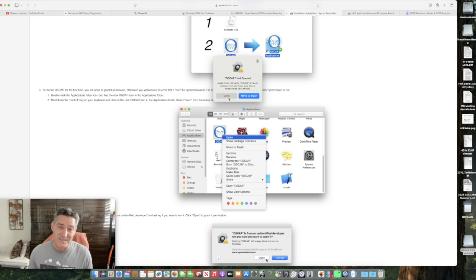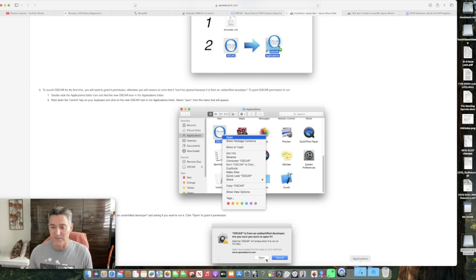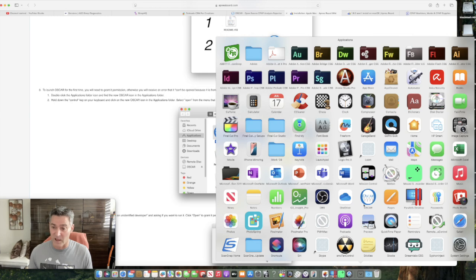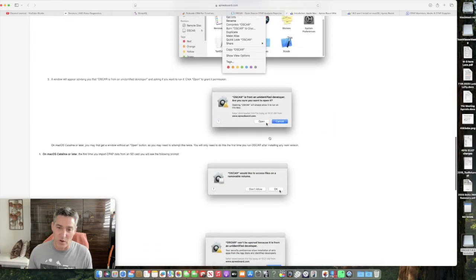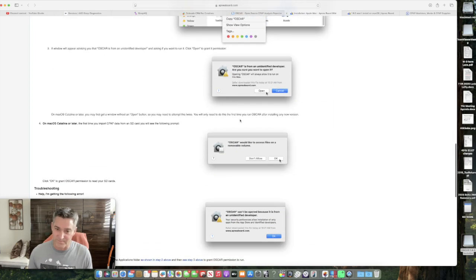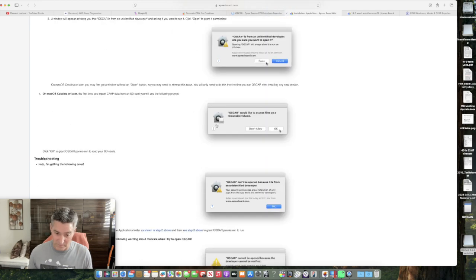Now in the past, doing that, you would get a little pop-up that said, are you sure? You seem pretty helpless. You want to open it anyway? You're going to destroy your computer? And you'd be like, yeah, I really do. We can't do that now. Well, actually we can. So we go through all this. We've already failed on all of this quite miserably.